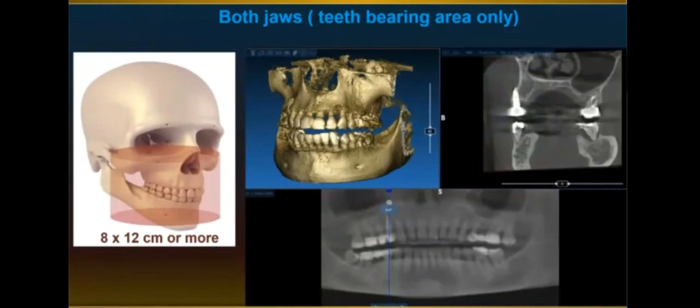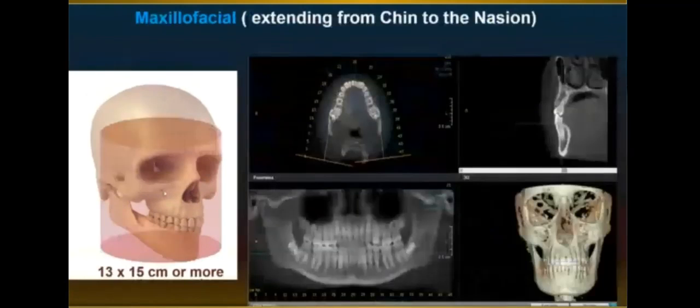They make like a huge artifact, more than having one alone. In addition, also, it's easy to check the implant planning if they are separated from each other, because you can remove the jaw, which is not the jaw of interest, and check the implant planning.